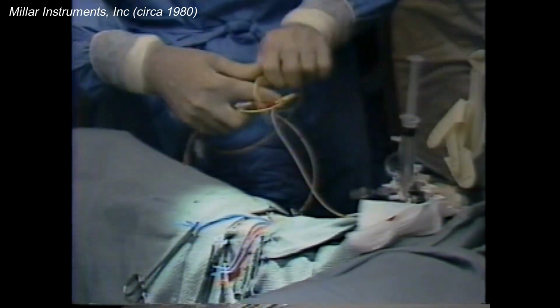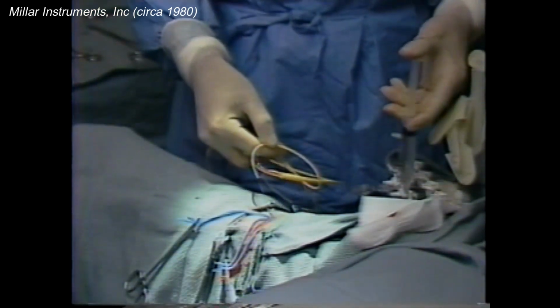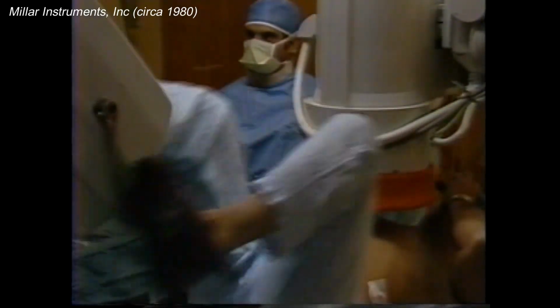Measurements made with external transducers are extremely susceptible to movement artifact caused by the inertia of the fluid in the catheter connecting the transducer to the patient. Such movement artifacts can appear in the form of catheter whip, where the tip of the catheter rhythmically moves with each heartbeat, or as random extraneous signals caused by patient movement or movement of the external tubing system.